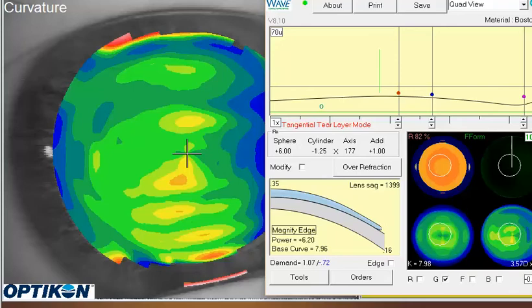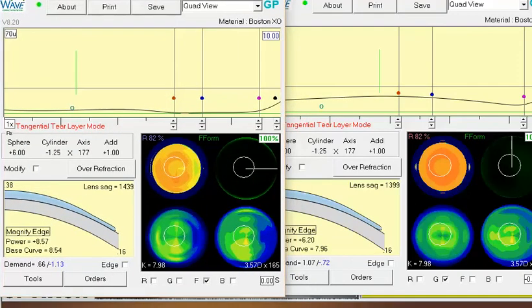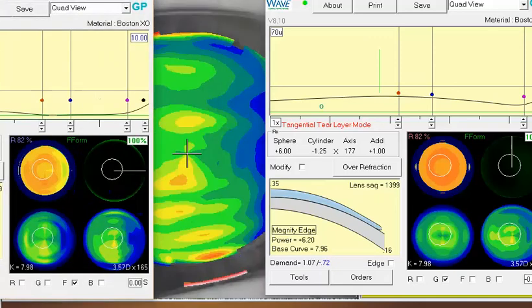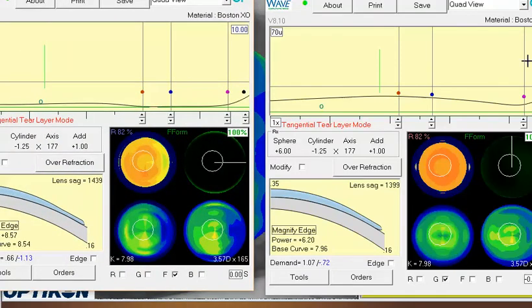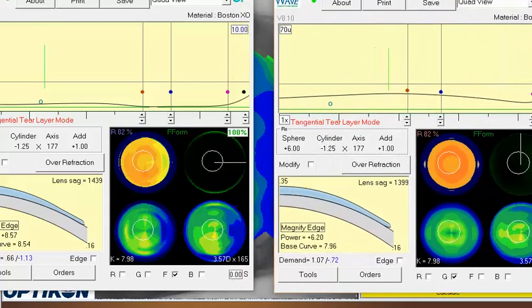So what I'd first do is go ahead and reopen up the lens, not averaging, and then you want to design off as much of this topography as you can. So if I show you a design here, I pulled up one here from the bottom. This is one where I did not average the astigmatism. And you'll see in that lower right-hand corner of the quad view, you've got a corneal topography that looks very similar to the actual patient topography, whereas the averaged corneal topography in the original design that you did seems to miss a little bit more, looks a little more symmetrical. So I think that will help if you get a little more data to design off of.